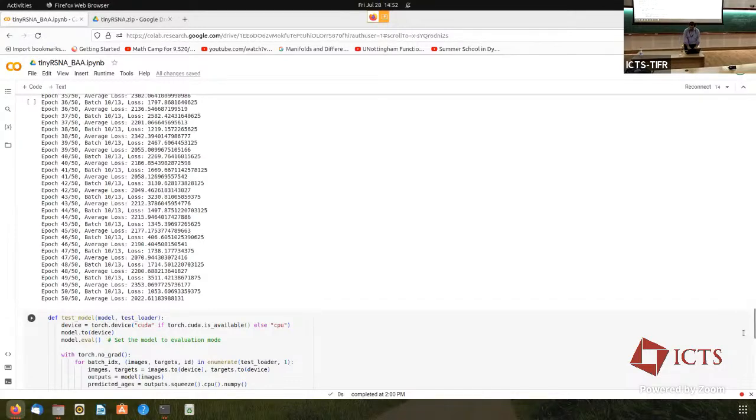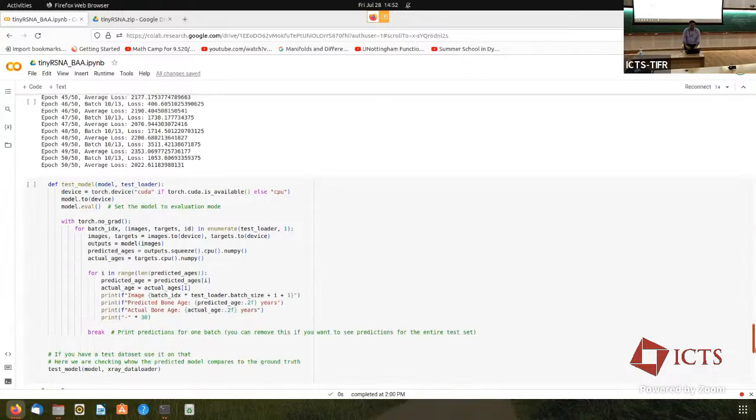And then I have a final function that says, okay, let me test this. So I'll let you write that on your own. It pretty much follows the same principles that we had included, except that when I'm calculating the output, now I don't need to do grad. So I will use torch.no_grad, because when you're just pushing out the model, you don't need to keep track of the gradients. The gradients were used for training and changing the weights. Now you're just passing your batch through and seeing what the output is. So you use torch.no_grad for that.